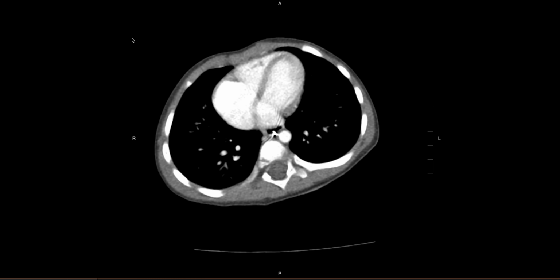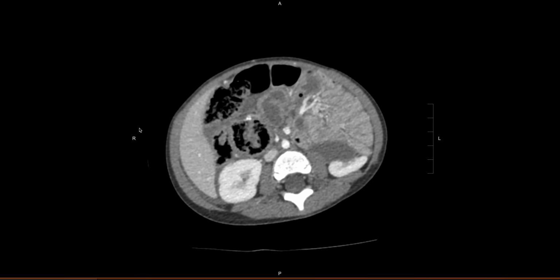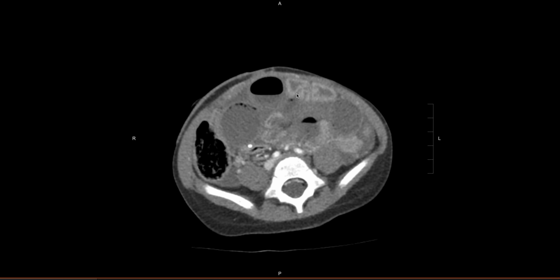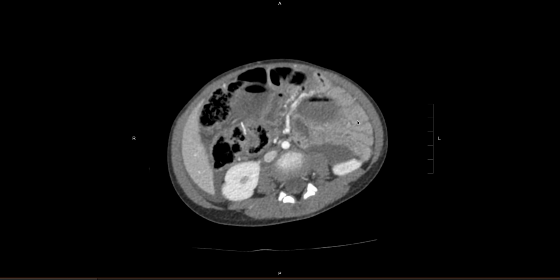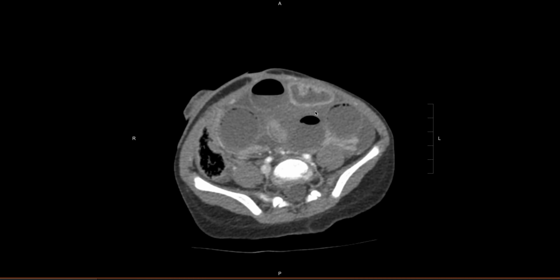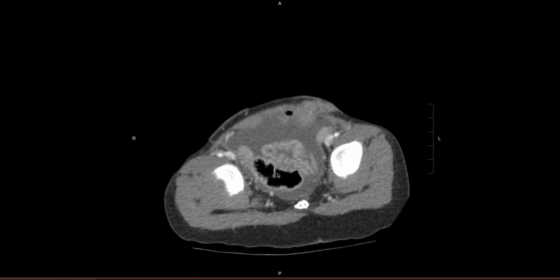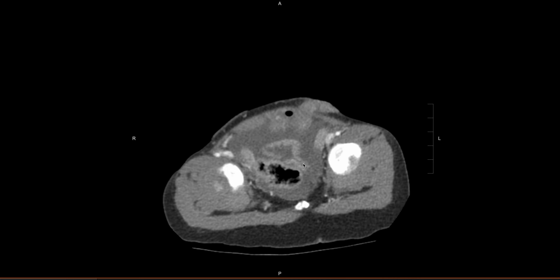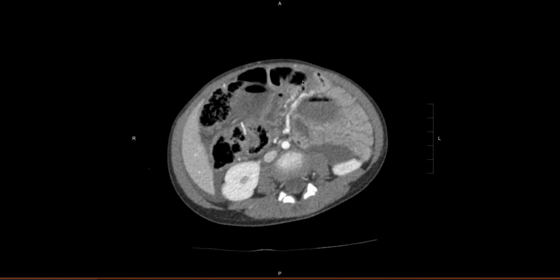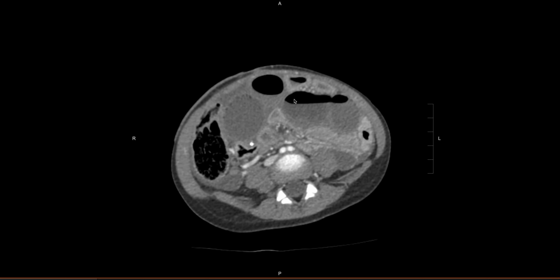It's a pediatric patient, a little complicated because they have prior surgical history with ostomies in place. But what I wanted to impress upon you is that as you go into the abdomen and into the pelvis, you see a difference in caliber between this decompressed bowel here and then this really distended small bowel there. And things distally, they're kind of decompressed and difficult to appreciate, but you have all this distal bowel that's decompressed, you have all that proximal bowel that's decompressed, so immediately you start to get a sense that this could be a closed loop, and it's definitely a small bowel obstruction.